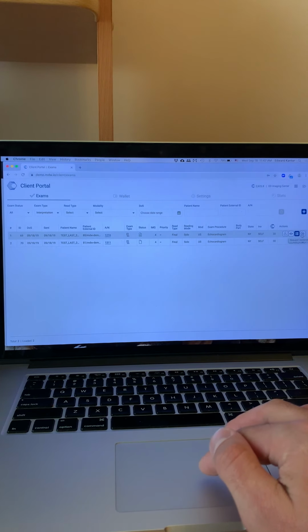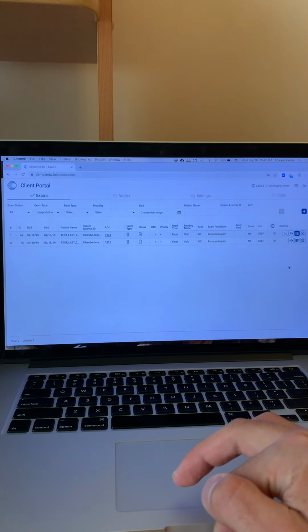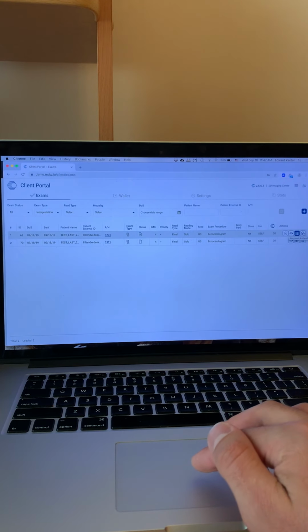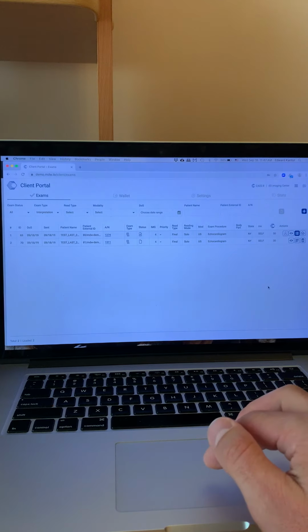In case the study that they have requested needs an addendum, because after a certain few days, it goes to billing, and the billing team might ask questions about updating the report information, they can also request an addendum. So this is already after the full circle review has been completed. There is also the ability to update the study. So this completes the demo. Thank you very much.